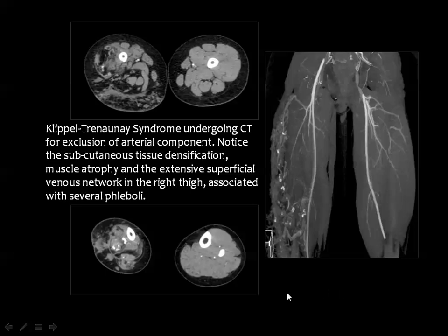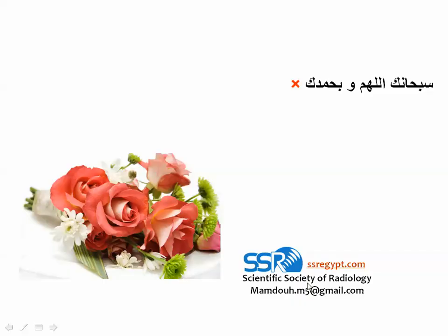And here is a CT scan of a patient with right-sided Klippel-Trenaunay. There is an overall increase in thickness of the limb itself, and these venous and lymphatic channels, and also you get the skin thickening with obliteration of the subcutaneous fat.